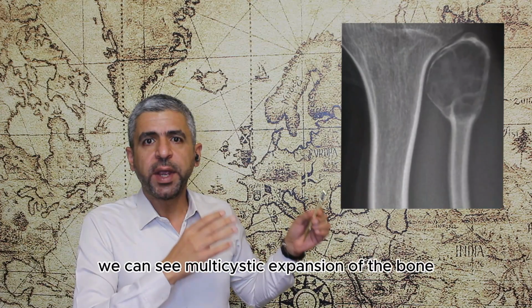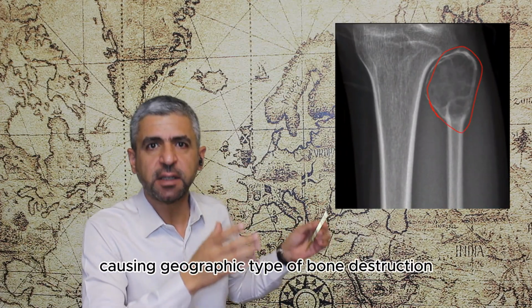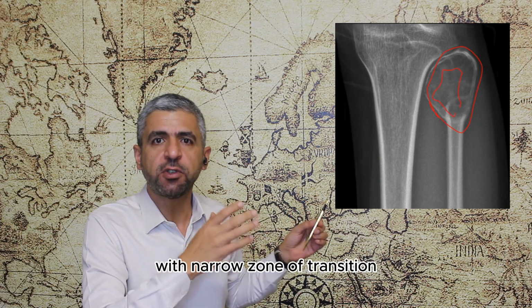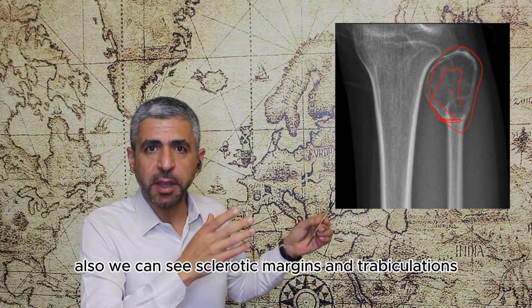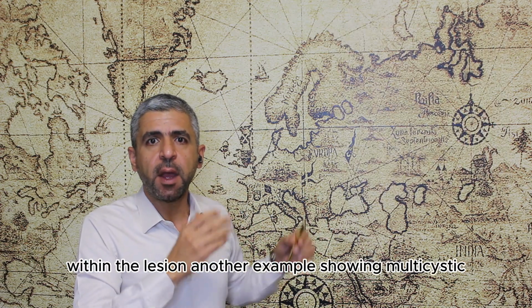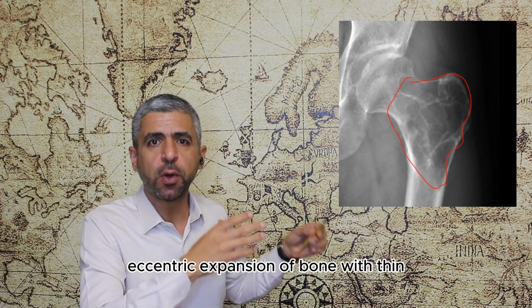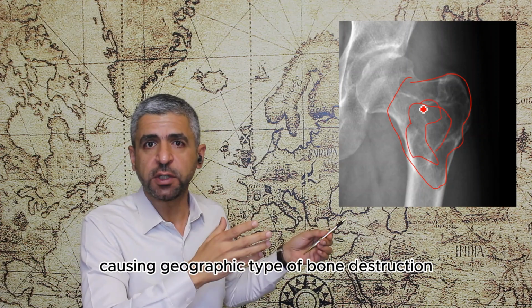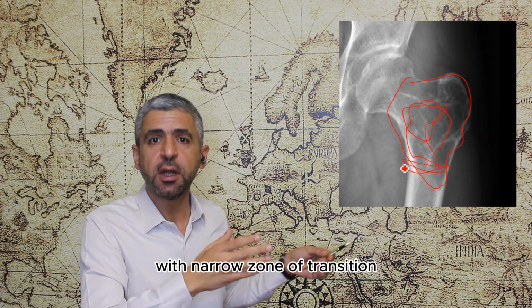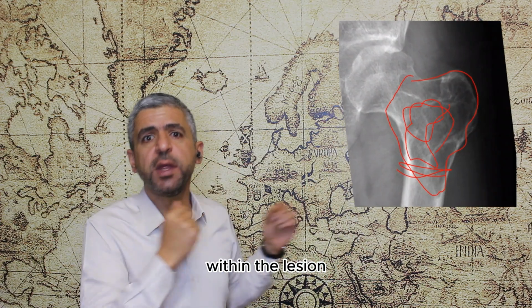As in this example, we can see multicystic expansion of the bone causing geographic type of bone destruction with narrow zone of transition. Also, we can see sclerotic margins and trabeculations within the lesion. Another example showing multicystic eccentric expansion of bone with thin periosteal reaction, causing geographic type of bone destruction with narrow zone of transition, and again we can see sclerotic margins and trabeculations within the lesion.